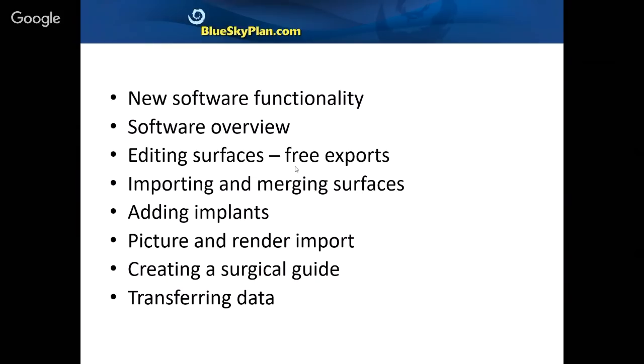You can add a base to a model. We'll see that as well. So as long as you're doing all of these manipulations prior to creating a surgical guide, and you have not yet created a surgical guide, or you're not going to be creating a surgical guide for that case, then the exports are free and they can be exported at no cost. Once the surgical guide is designed and fabricated, and then you want to export from that case, then the normal fee does apply. And of course, what we're referring to are the paid STL exports that can be purchased directly through the software via the Blue Sky Bio website that allows to export of the surgical guides from the Blue Sky Plan software.